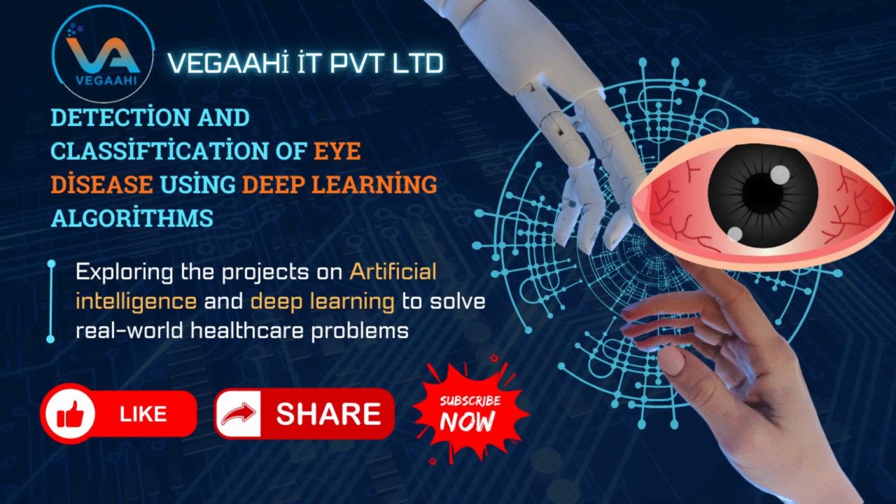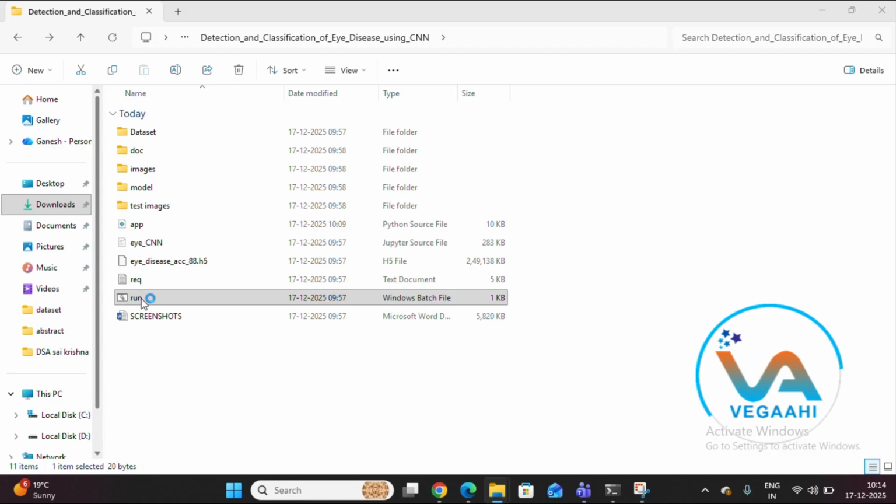In this video, we are showcasing an AI-based eye disease detection project developed by our experts at VEGAAHI IT Private Limited. This project demonstrates how students can apply artificial intelligence and deep learning to solve real-world healthcare problems using industry-standard practices. Now we'll see the execution process, and you can observe the batch file.